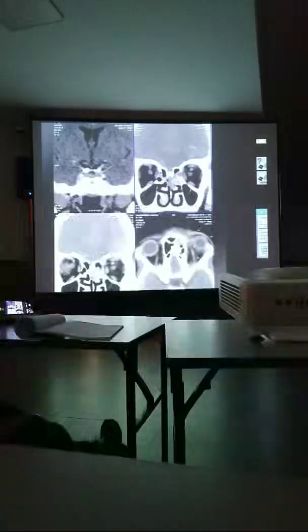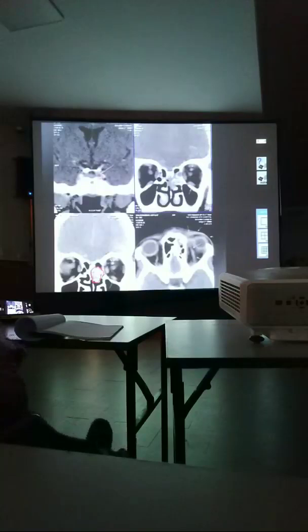There is an infection with hyperdense material in the ethmoid sinus, gone to the orbit. You can see the cavernous sinus filling defect, dilated SOV over here, edematous extraocular muscles, dirty fat. That means pre and post septal cellulitis, and cavernous sinus thrombosis responsible for this. This is the typical appearance of mucormycosis.